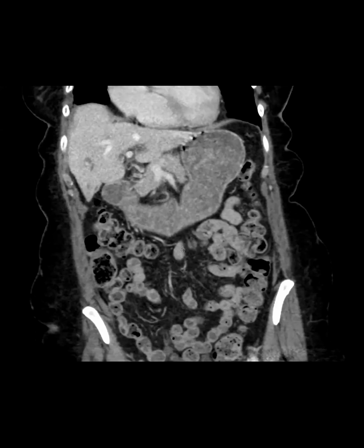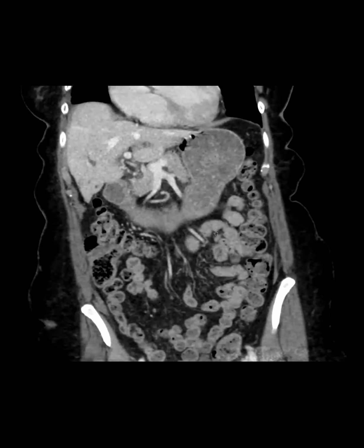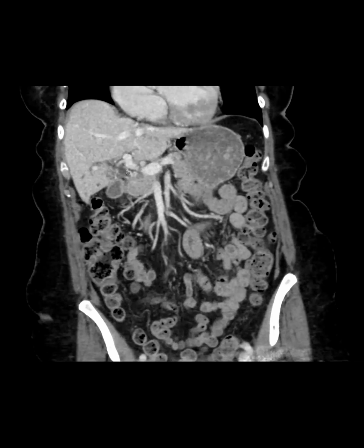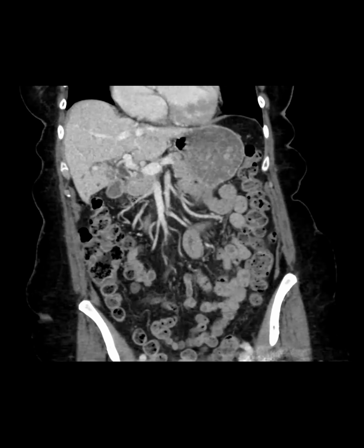And then the patient came back and had this. This was cholangiocarcinoma. Wow. If you look back, this is the more remote scan. There's the duct. And you can see it right here, barely, right there at the CBD. I don't pay very much attention to the CBD on CT, and now I do.